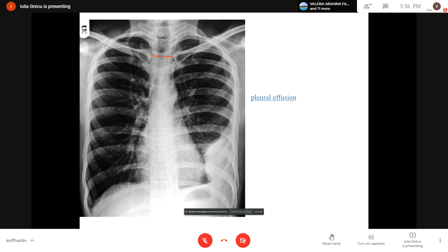Another, is the structure homogeneous or inhomogeneous? Homogeneous. Okay. Is the intensity small, medium, or very intense? Medium, I would say. Okay, it is good. It is a medium intensity.